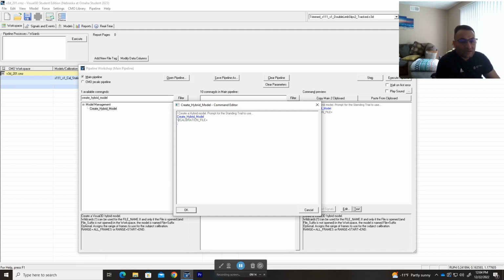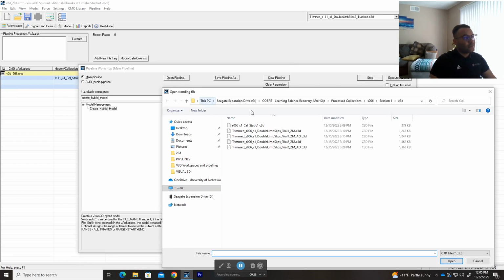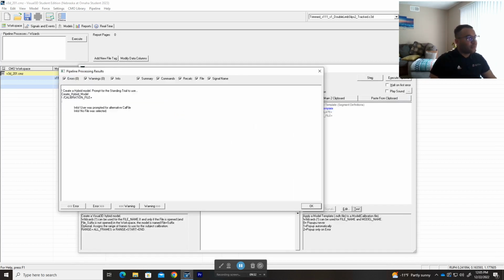It's basically like MATLAB, but MATLAB uses the percentage sign. Here they use the exclamation mark. Alright, so when you keep it like this, it will prompt you to open. So for example, when I step on this, it will prompt you to open any file you want, so it's good to just keep it like that.